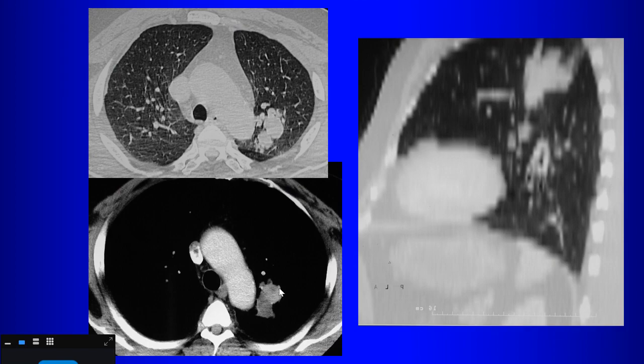What's happening here? Some sort of enhancing lesion. So the patient was given contrast, so there is enhancement, right? To be sure there's enhancement, you want a non-contrast CT to prove that that is actual enhancement, but if there's an enhancing endobronchial component, then we like carcinoid for this, right? What if it looked like that on non-contrast CT? What would you think about?